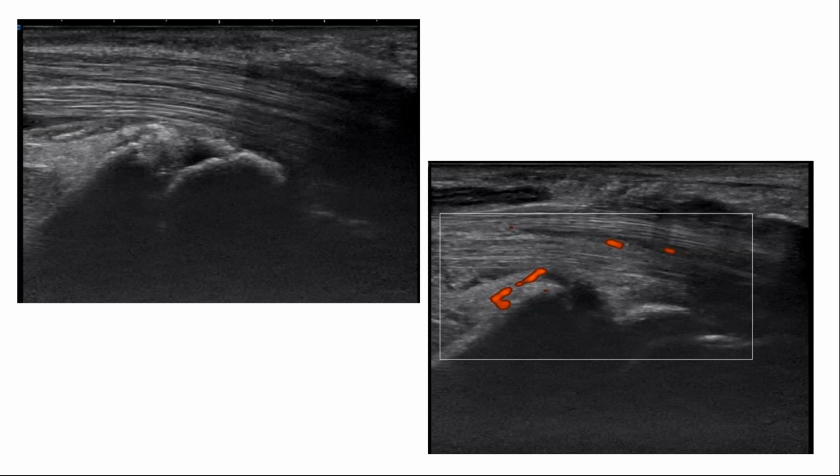So there is definitely median nerve enlargement, and the median nerve is hypoechoic and swollen. But in addition to that, other changes, how would you define it? I'd say vascular changes in the flexor tendons, suggestive of thickening and fibrosis, and cortical changes in the radius, suggestive of arthritic changes.